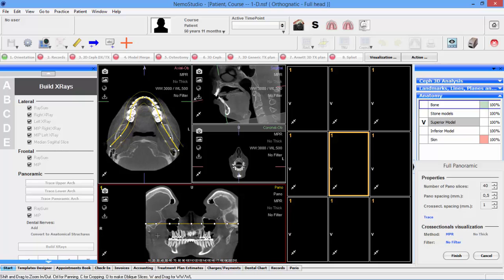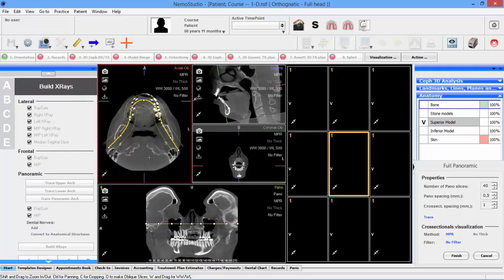Check that the condyles are there and that you don't miss any area in the condyles. Okay, and now you should check that you have bone over here and bone over here. So move this a little to the anterior part to get some tissue here. And now do one thing, just move through from the upper, and you see that you are covering.